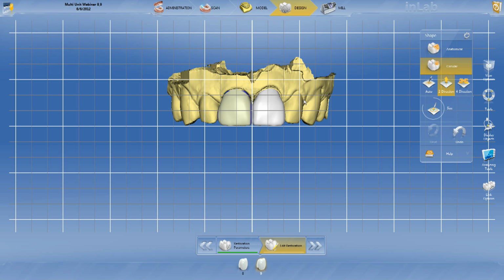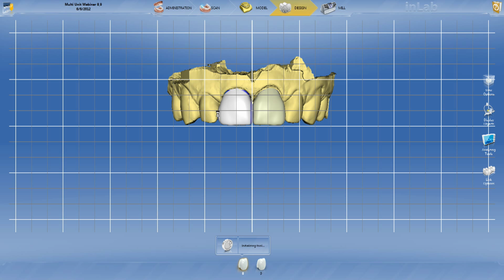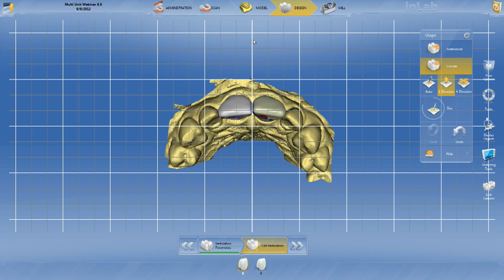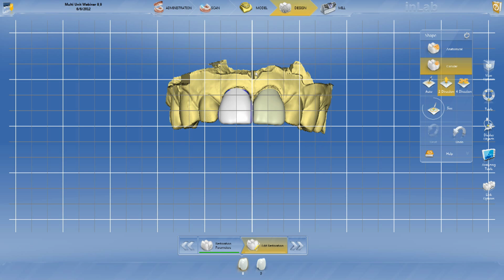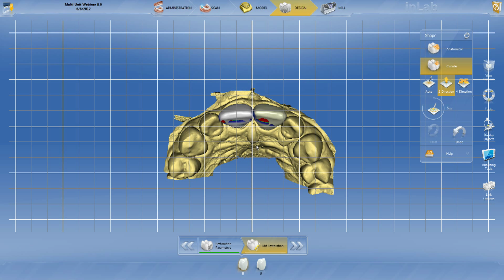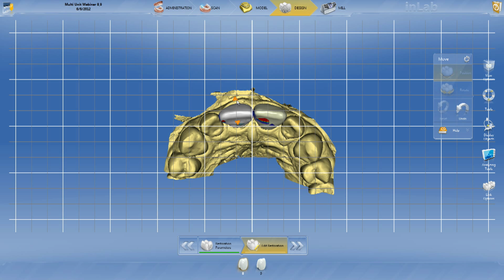Of course, if you're capable of milling models, we can always make our adjustments if we don't get it that perfect. But you definitely have the ability to position things where you want them. Like I said, I use the move tool a little bit here and there, depending.